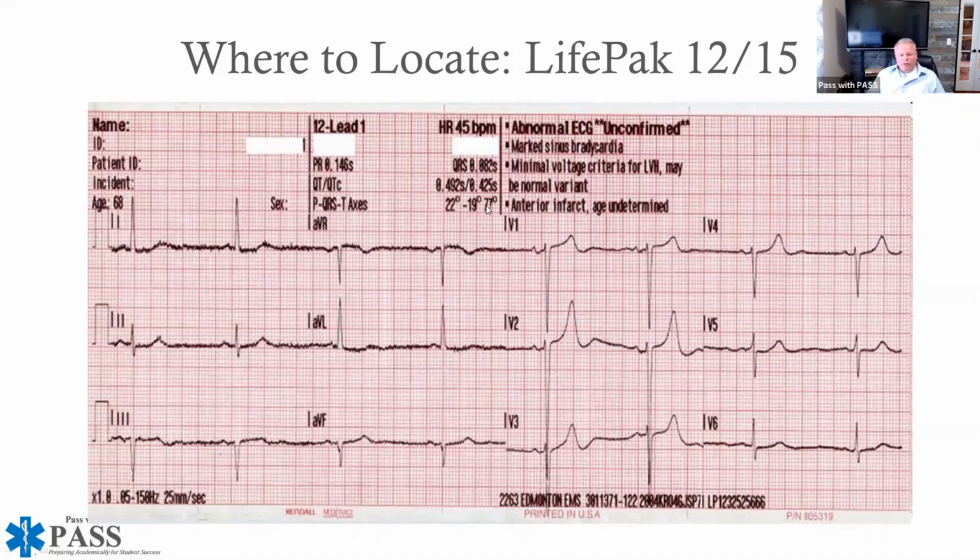And remember, we're only really focusing on the QRS. So this is a -19. What is our normal? The normal is -30 up to a +90. -19 falls inside of that. So this is a normal axis. This is nothing abnormal here, but that's how you would do it, basically looking at the machine.